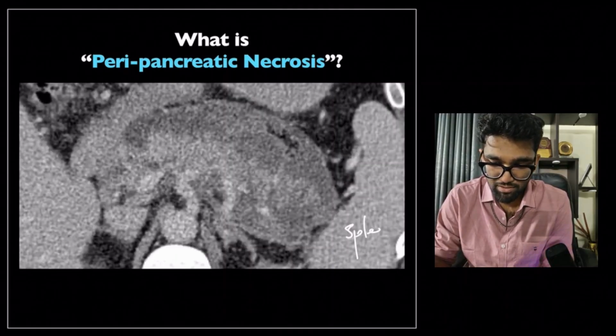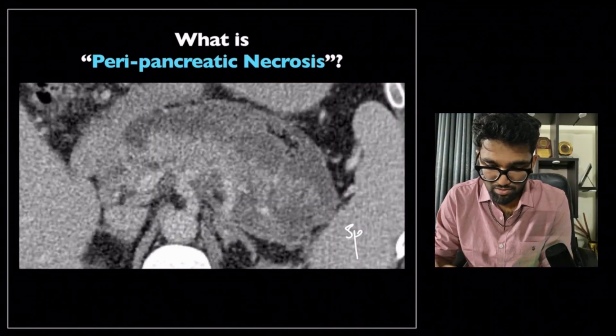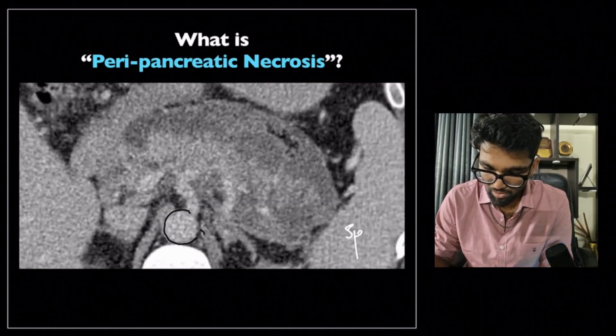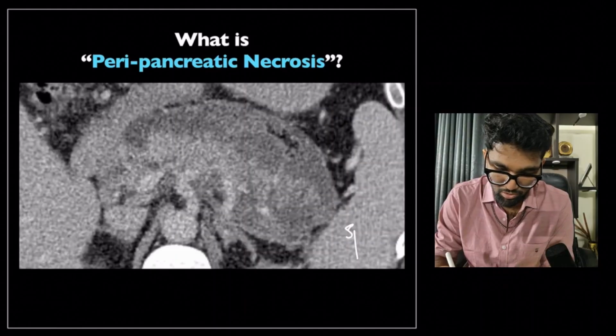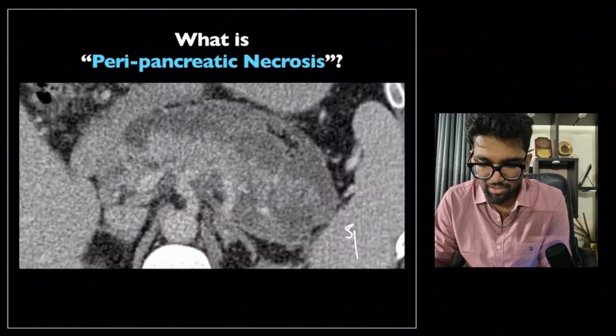So this is obviously the spleen. This is obviously the liver. That is very clear. This is the vertebra at the back. Just anterior to the vertebra, we have our aorta. I'll use red for that. The aorta is giving off an artery anteriorly. This is probably the superior mesenteric artery.